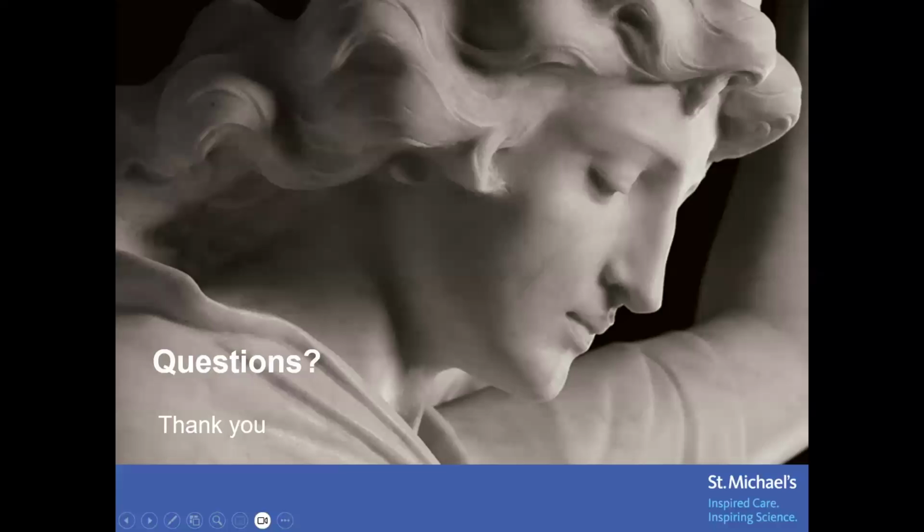You can use the pressure half-time measurement, like for the pulmonic valves for pulmonary hypertension, just to get the number right. You can just measure. Yeah, it's better to just use the label measurement, I think. Label measurement and just check for time. And then make two measurements, one for the acceleration time and one for the ejection time, and do the math.